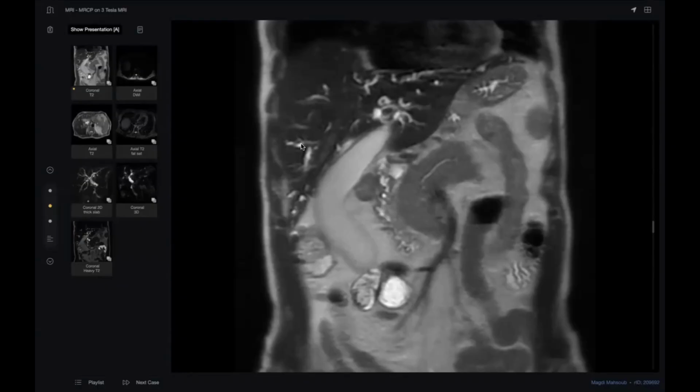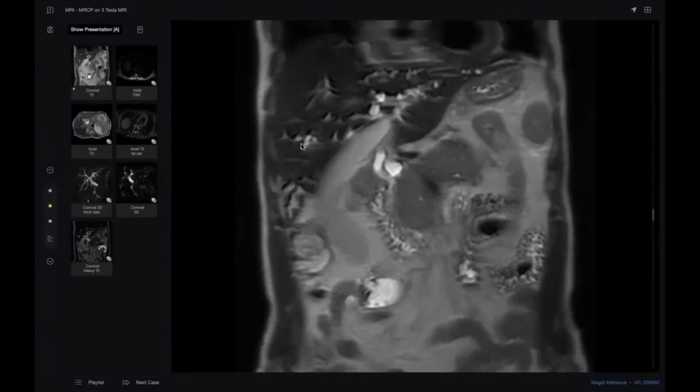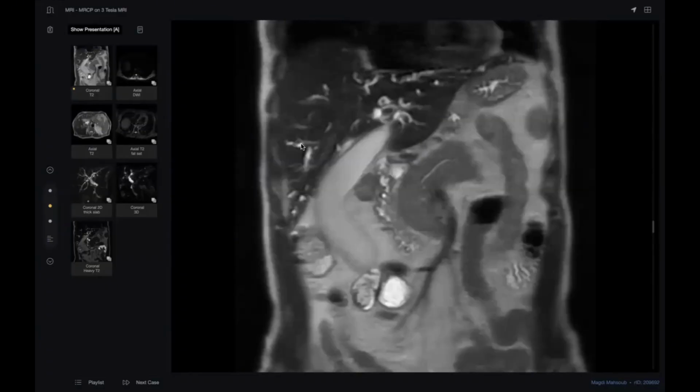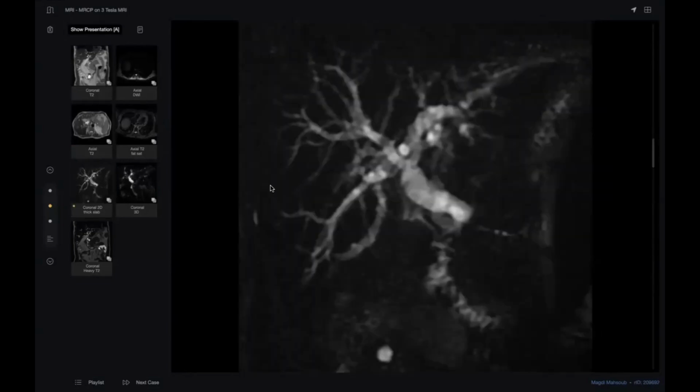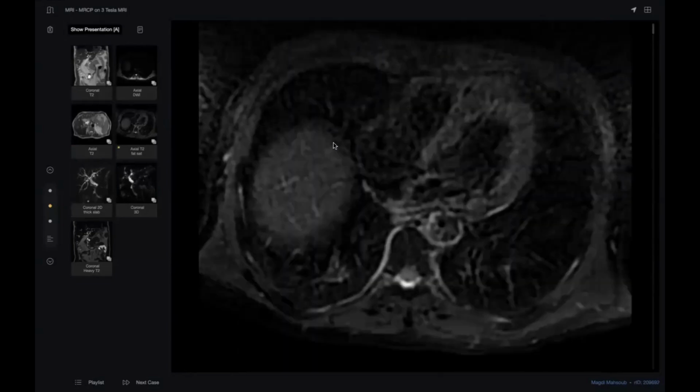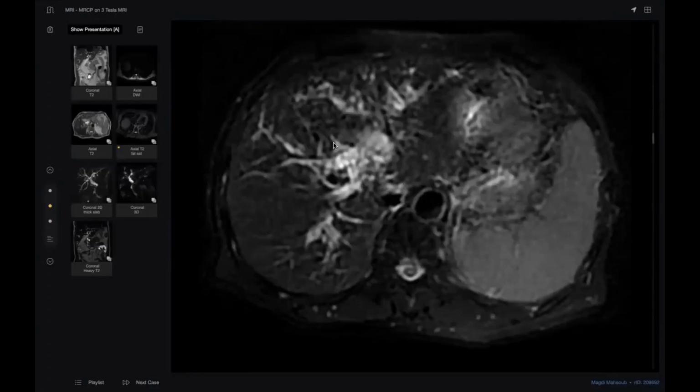Okay, sir. Look here. Look at the middle, please. Sir, there is an isointense lobulated mass which is noted just in relation to the medial part of the duodenum. This is not a mass, doctor. This is a structure. This is an organ.